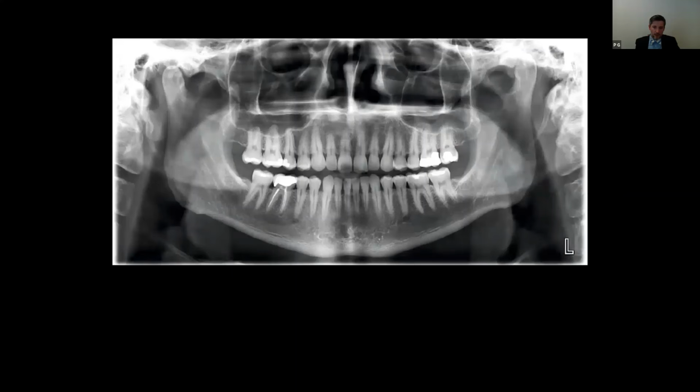Okay, so really looking at everything outside of the region of interest, outside of the teeth, that holds true with any image in dentistry, like this pan, for example. We're used to seeing pans every day in our practices. It's something we're all familiar with, but there's a lot of anatomy here to see besides just the teeth. Only problem is it's all squished on top of each other. All the anatomy is superimposed. So we're left with a 2D representation of a 3D object.